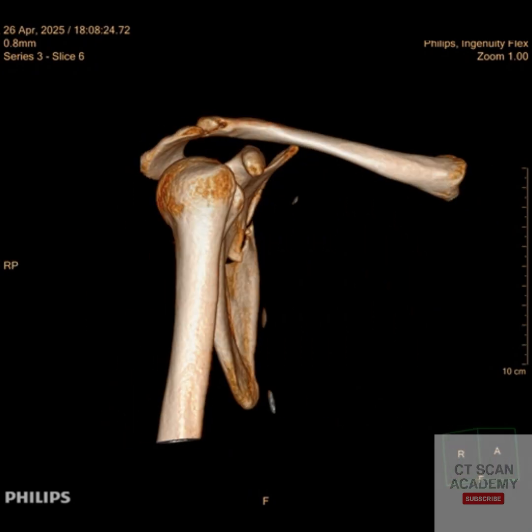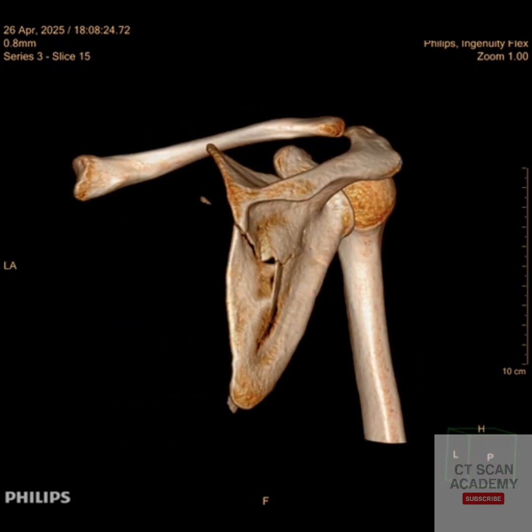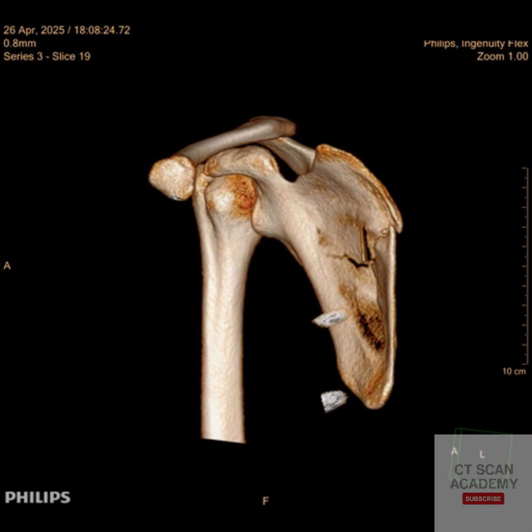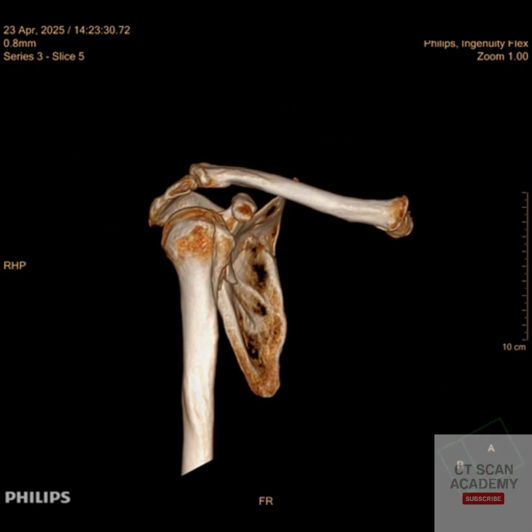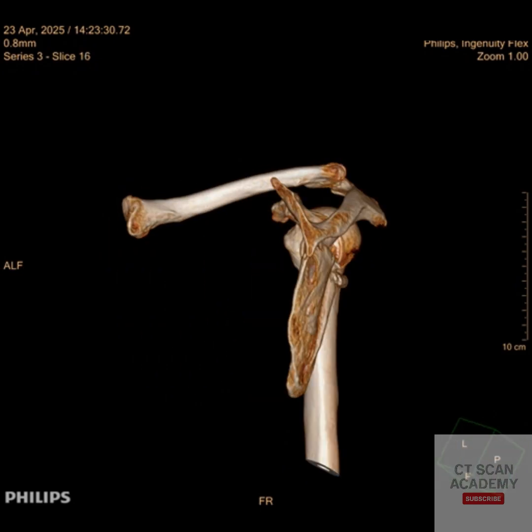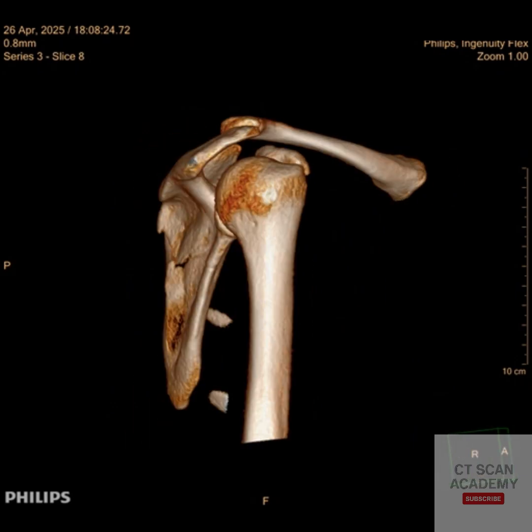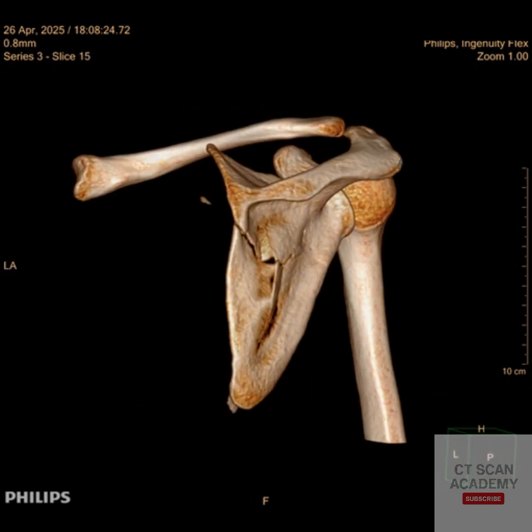A scapular body fracture, known as a transverse scapular spine fracture, typically shows minimal displacement due to surrounding muscles stabilizing the bone. It may present with severe shoulder pain and limited movement. It is often not visible on a frontal shoulder X-ray and is generally managed non-surgically.